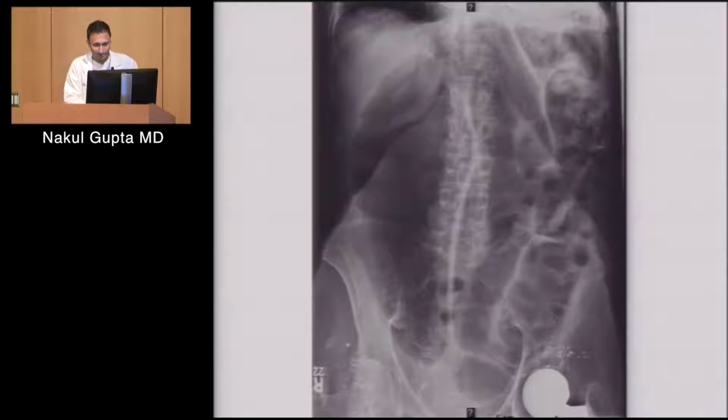Okay, let's talk about this one. This is another acute case here. So what's most impressive here, I'm going to assume it's as impressive to you as it is to me, is this guy, right? So we have this large distended segment of presumably bowel, and it kind of looks like it's coming out of the pelvis, right? Kind of coming out of the pelvis and extending up into the right upper quadrant here. And incidentally, the patient's probably been shot before.